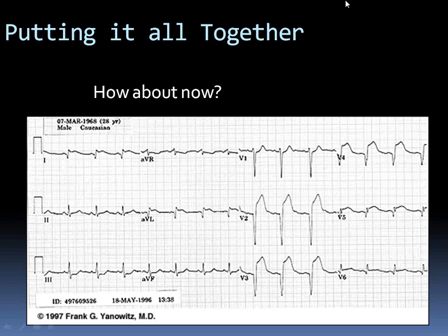Yes. So I'm saying that this EKG over here is about a patient who comes in to the ER with chest pain, right? Now, whenever you see such an EKG, what do you think is going on here? On this ECG. Good, good.